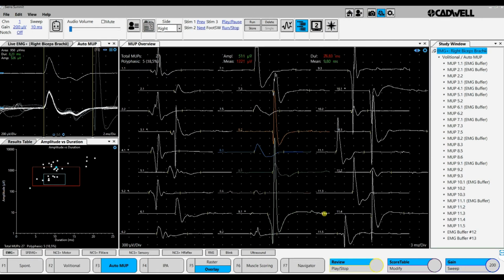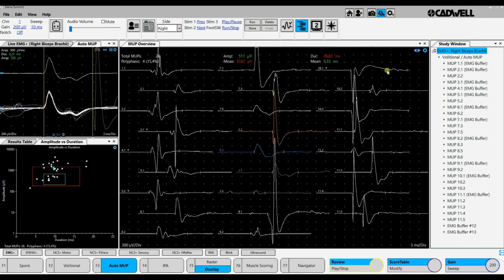In this case, for example, we can either remove the signal, which I prefer, but we can also set the cursor manually. And when I press on the cursor, the amplitude goes up to 100 microvolt per division, so that all settings are made with a standard gain. Then this one is the same thing. I removed that one.